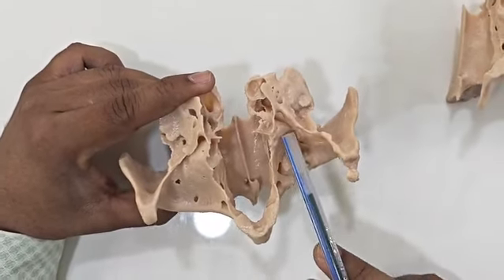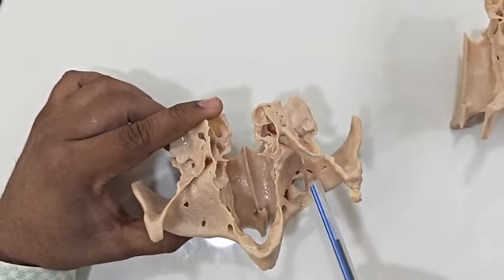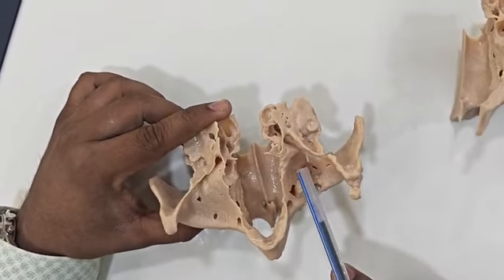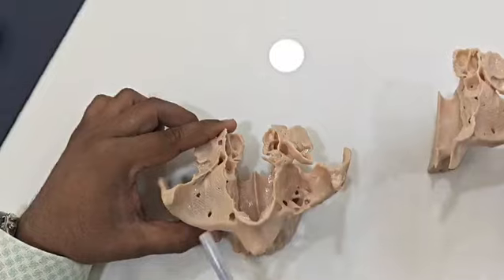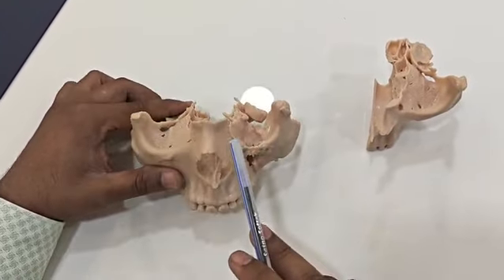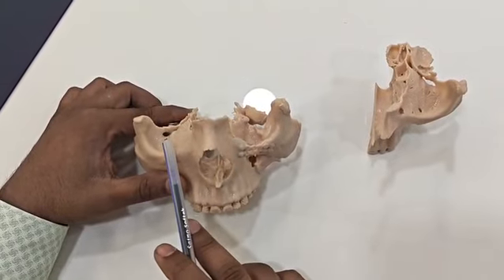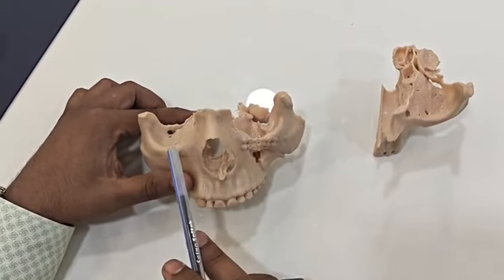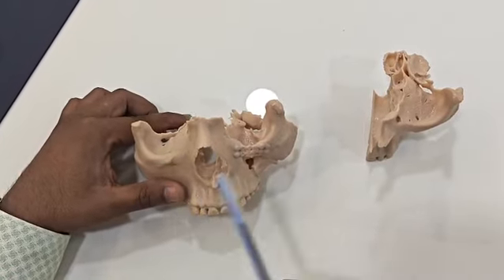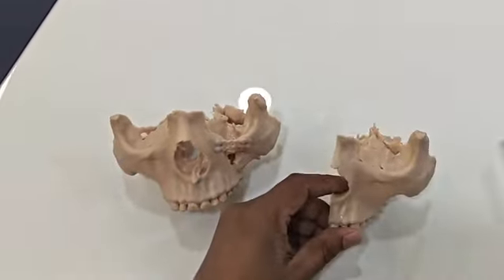There is absolutely no floor over here, so we are planning to reconstruct here. And of course, because of the herniation of the orbital content into the maxillary sinus, there is an unequal pupillary level. What we planned is, from this particular model, the right side is healthy, so with the artificial intelligence software and with the mirror imaging impact, we created another model of the left side itself.